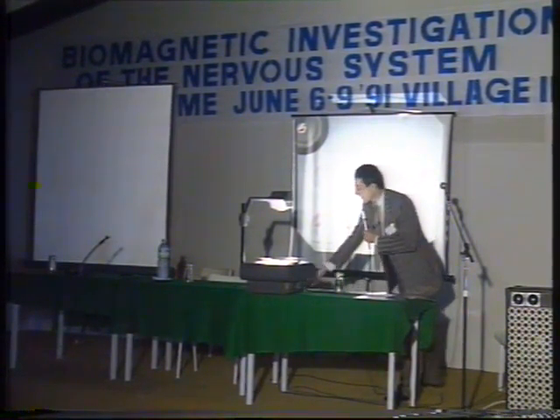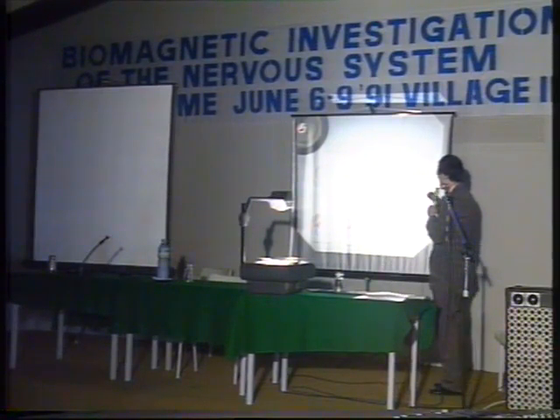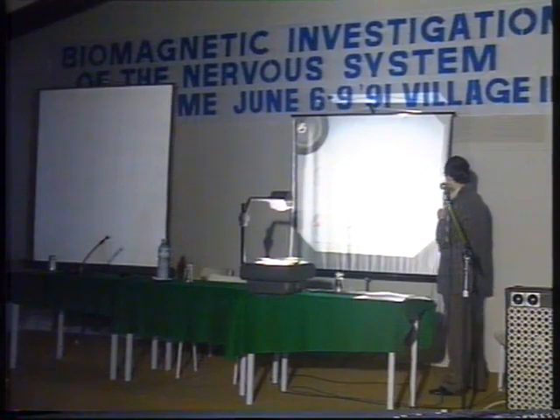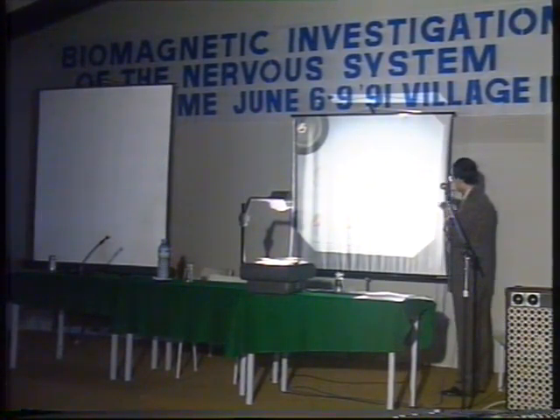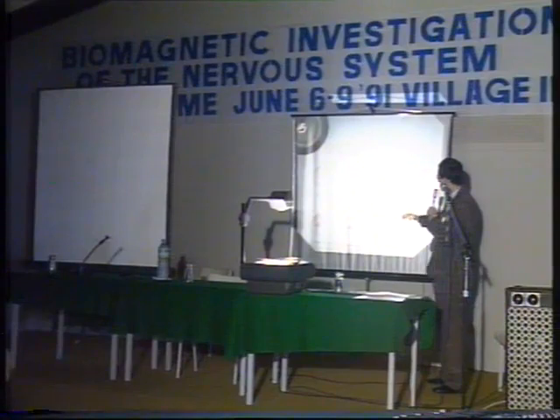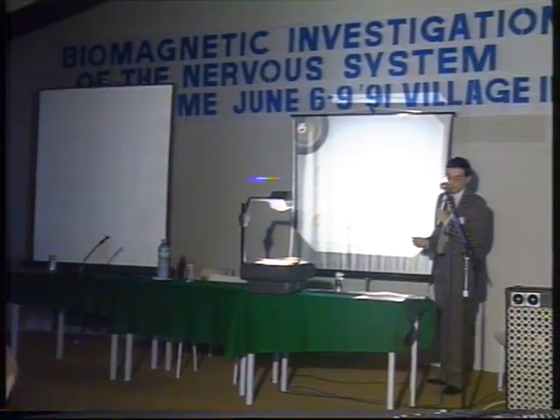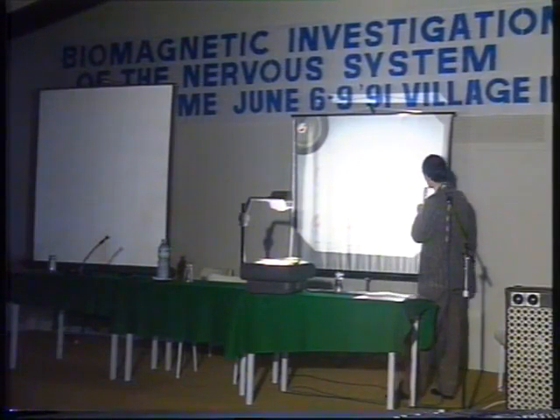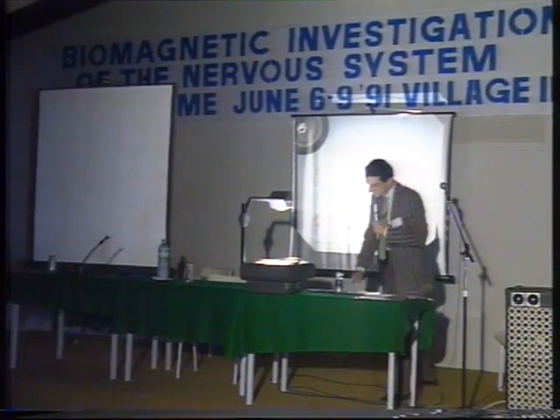Lost my pointer, okay. And this is the good side, and the data are good. The dipolar looks fine, the amplitude is okay, and also the latencies, of course you can see it's almost 25 milliseconds, but we are also dealing with a man of 75 years, so this is possible.